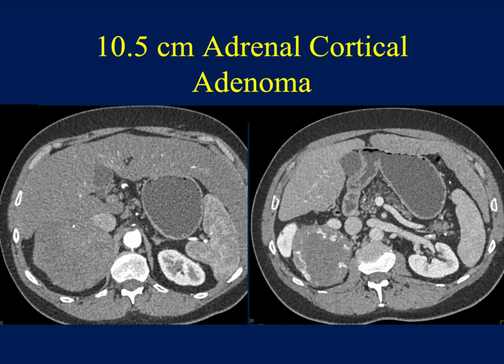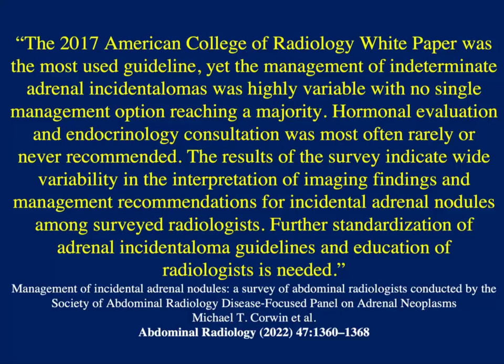I would admit it's a funny appearance. Most pheos are homogeneously or diffusely enhancing, though we do know that pheos can be cystic, but this is kind of looking almost like a hemangioma of the liver. You have a lot of peripheral enhancement, and the lesion is fairly homogeneous in terms of enhancement otherwise. Well, believe it or not, that was an adenoma.